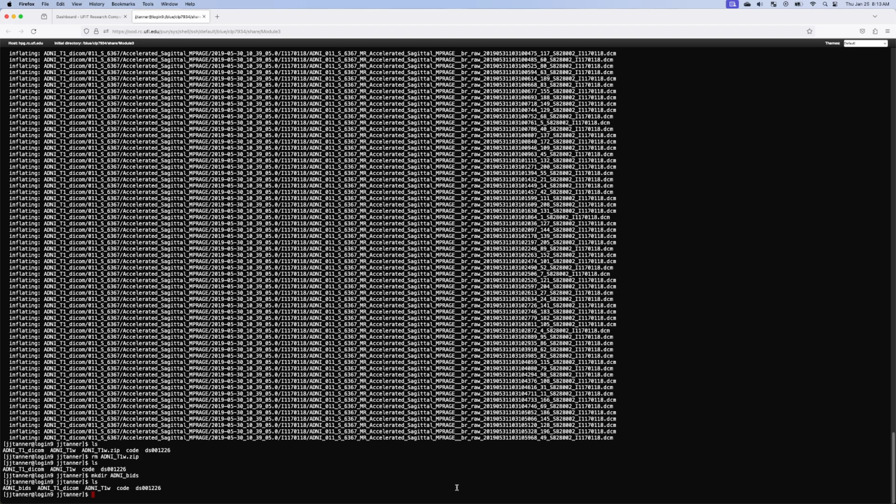To do that, we're going to use a software called dcm2niix. Now, normally we would do this within a script because it could take longer. We're trying to do this on a lot of participants, but because we only have 2 participants and it's just going to be one image for each, we can do this live.